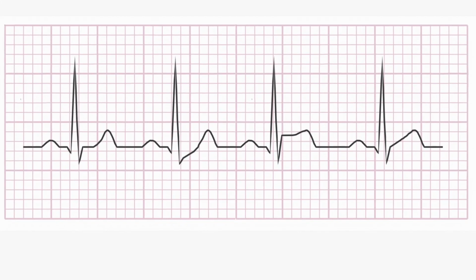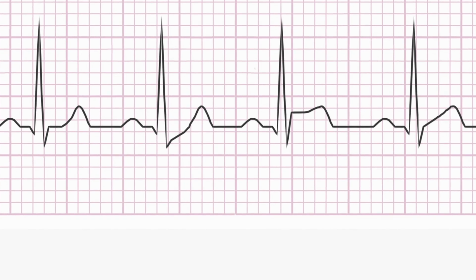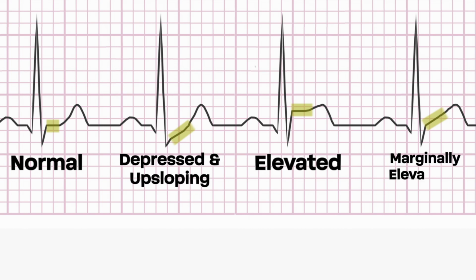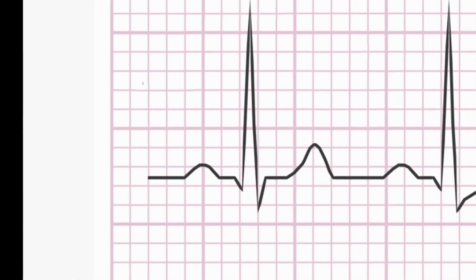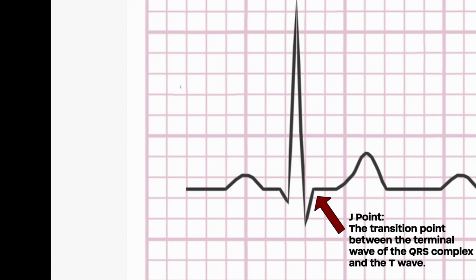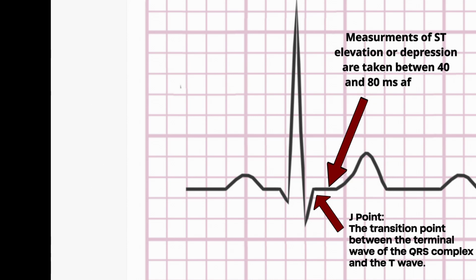The last segment we'll talk about today is one of the most important day over day, and this is the ST segment. The ST segment is the period of time between the last movement of the QRS complex, whatever that is, and the beginning of the T wave, and what is being visualized here is the behavior of the ventricles during contraction. In other words, when they're doing their work. Very generally, the ST segment should remain flat and level with the baseline, and deviations away from that suggest functional changes in the ventricular myocardium during contraction. That translates to either ischemia or the death of cells.